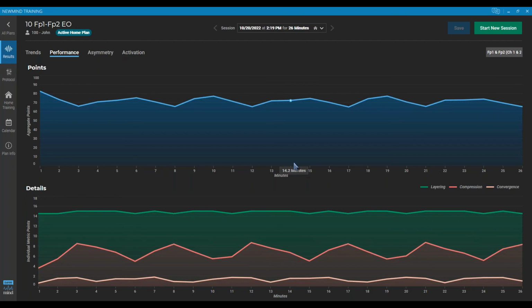So I just wanted to mention that, because allowing your home trainers to see their session results can be a real blessing for some of them. For other home training clients, it could be a nightmare for you, because they might be calling your office every other day wondering why these points are all over the place. So setting expectations with them, if you're going to allow them to see them, would be recommended.